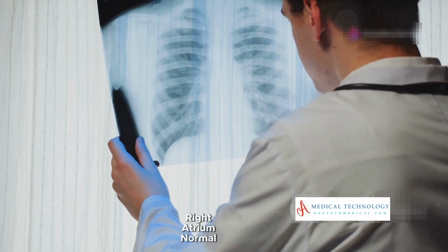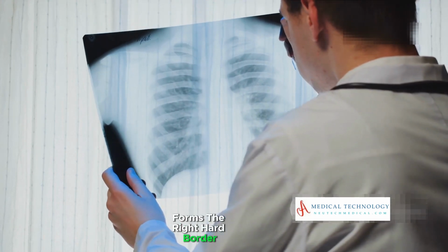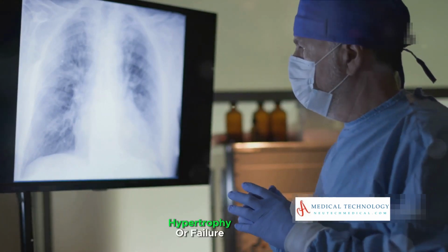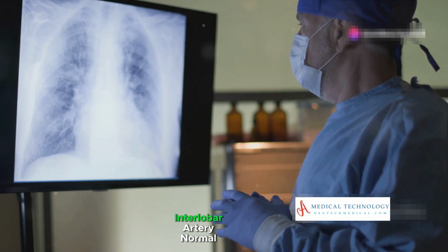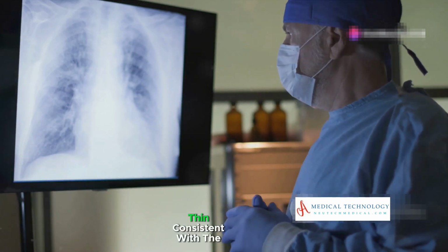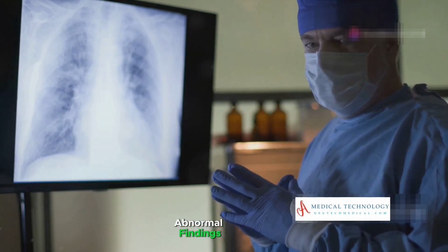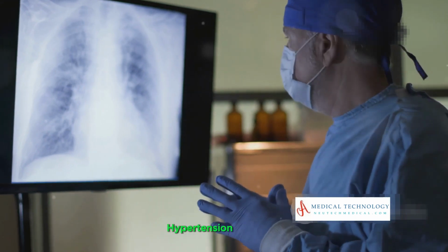Right atrium, normal appearance: forms the right heart border. Abnormal findings: enlargement indicates right atrial hypertrophy or failure. Interlobar artery, normal appearance: thin, consistent with the pulmonary artery size. Abnormal findings: enlargement suggests pulmonary hypertension.